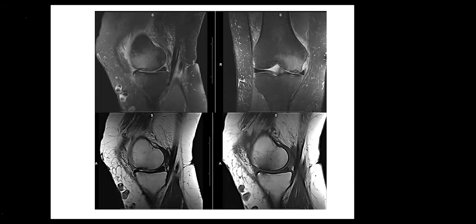This is associated with surrounding soft tissue edema. I give a differential diagnosis for this chondral bony defect.